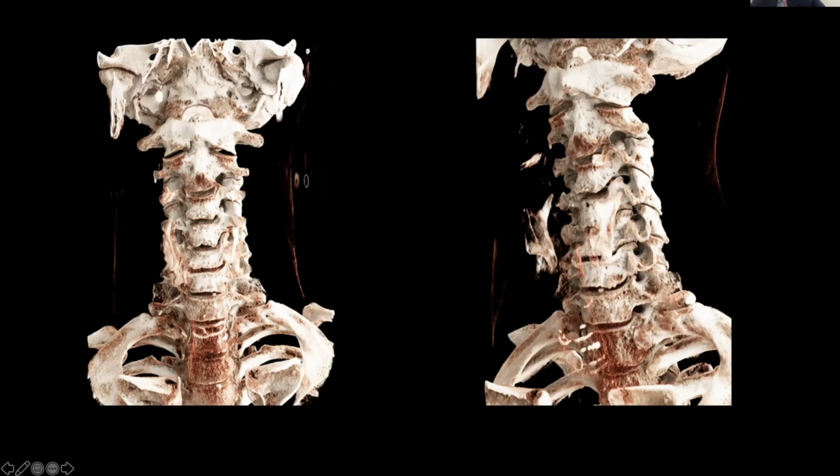On traditional CT or MR, you often hear people say the neural foramen is narrowed because of facet arthropathy, facet hypertrophy, or uncovertebral hypertrophy. The uncovertebral joints were always this sort of imaginary, magical place that I only heard about when discussing nerve roots on cross-sectional imaging.